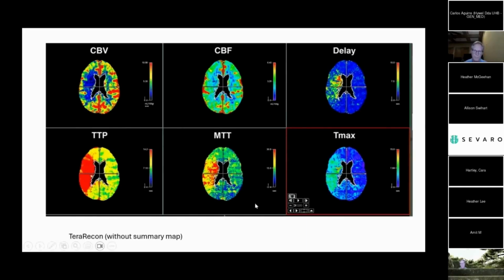So in this case, we're looking at the MTT, right? MTT is elevated where it's red and yellow, so there's decreased perfusion. And let's jump over to the CBV. So in this case, guys, think about it. The cortex here matches the cortex here, so this will be penumbra. The dark part here is going to be your core infarct.